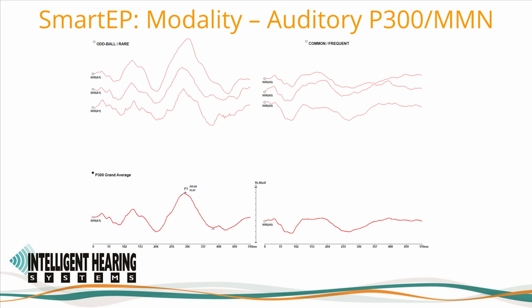It is important that if something like this is used, that it does not introduce unnecessary EMG artifacts into the recording. Here, on the left side of the screen, you will see the oddball rare responses tagged as buffer 1, which shows the P300 peak. And on the right side, we see the common responses tagged as buffer 0.